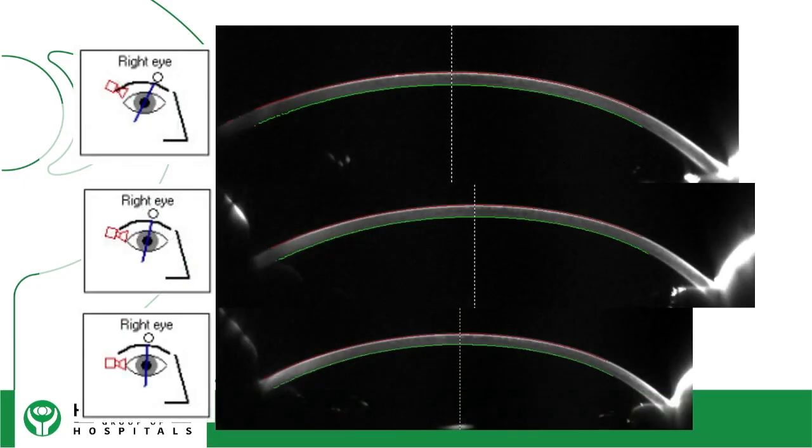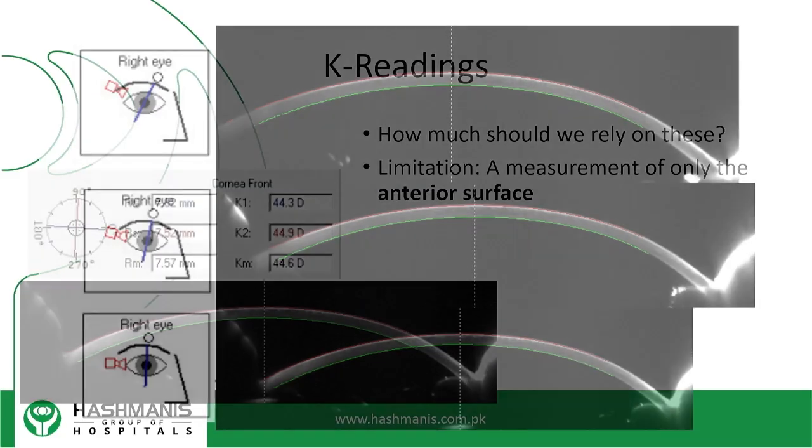So what are the raw images for the Pentacam? These are the Scheimpflug images, and you check if the segmentation was done properly, and if there is anything else that you missed at the back. All of these maps that you see on the Pentacam are always based on the raw images and the segmentation that you see here. If these segmentations are not properly done, then all of your maps are going to be skewed, as you will see later in the presentation.